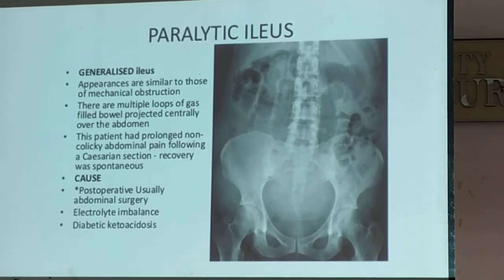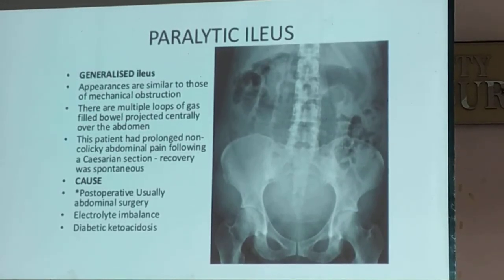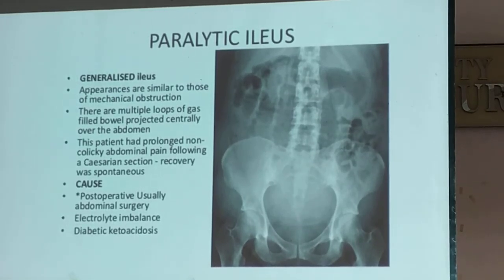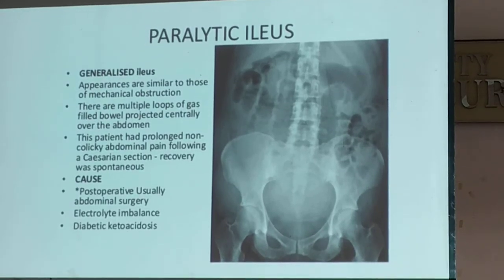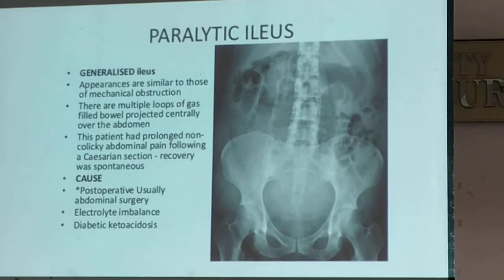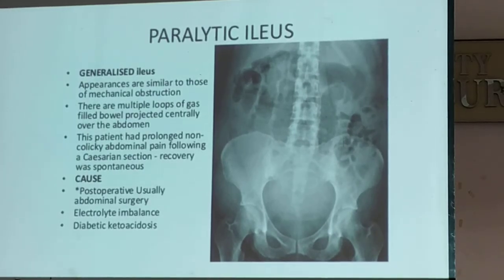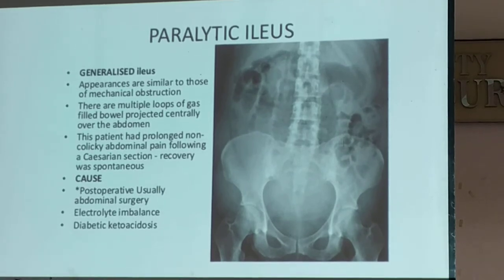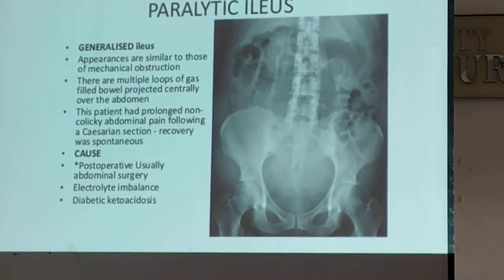So, this is considered actually as, normally yung mga radiologists would read this as ileus. So, this is not really very, very significant. Parang napaka-general nito. Anybody who's experiencing pain, kahit toothache lang yan, pa-flat plate mo, may ileus. Okay? So, what's important is, you have to do your physical examination. Okay?